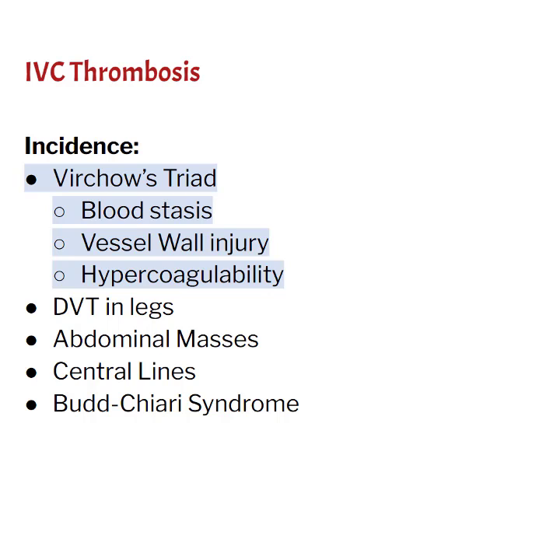And then lastly, we might see some clot in the IVC due to Budd-Chiari syndrome. If you recall, Budd-Chiari syndrome is the clotting of the hepatic veins that can cause blockages in the liver, but that clot can propagate then into the IVC.